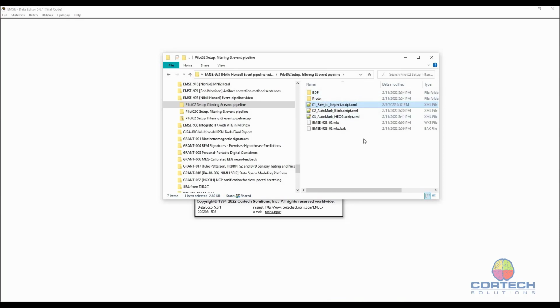It's going to apply the filter pipeline, and it's going to save the result to a new file, which importantly the digital IIR filter will be applied to the whole data set, so that any filter warm-up artifacts will be out at the edges, and otherwise the filter will be continuously applied throughout the whole data set.